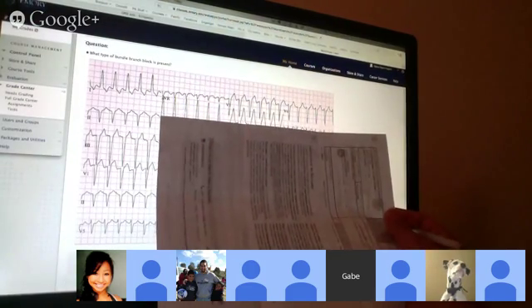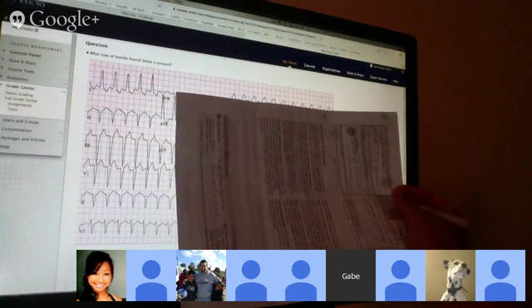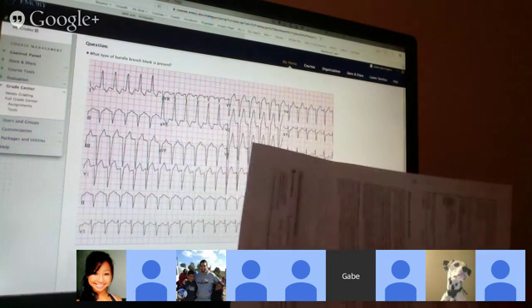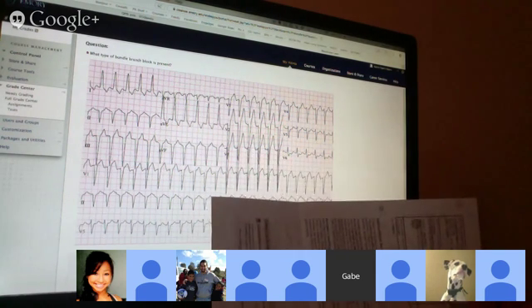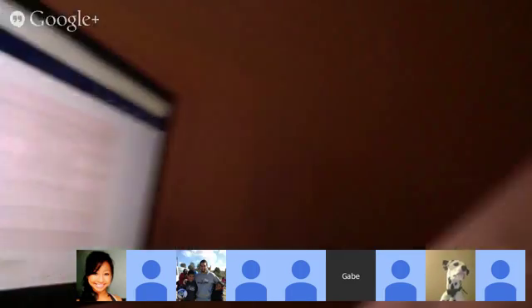So we look here, and I'm lining it up. Can you guys see that? Trying to line up the left tick mark with the beginning of the QRS. And I see that the QRS ends more than halfway through that box. Does that make sense? Yeah, I just have trouble finding the starting point of the QRS and then the ending point. Yeah, and that's why it's helpful to review all of the leads to look for ones that have a nice sharp beginning and end.